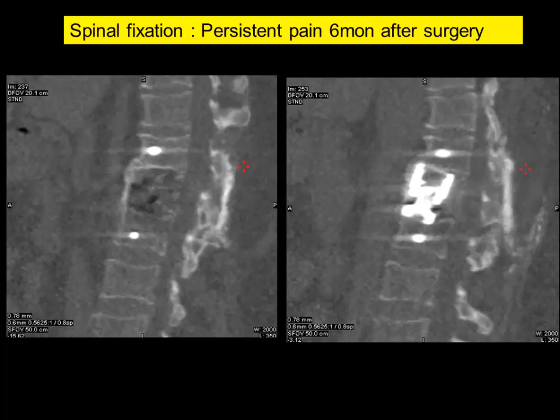This is another spine, projected nicely. So this patient had vertebroplasty and a spacer device between the disc, probably had reduction in the vertebral heights there, fracture. These are the transpedicle screws going through.